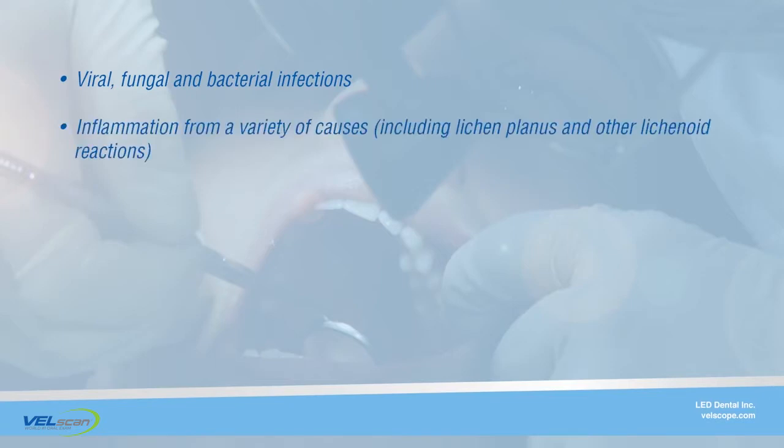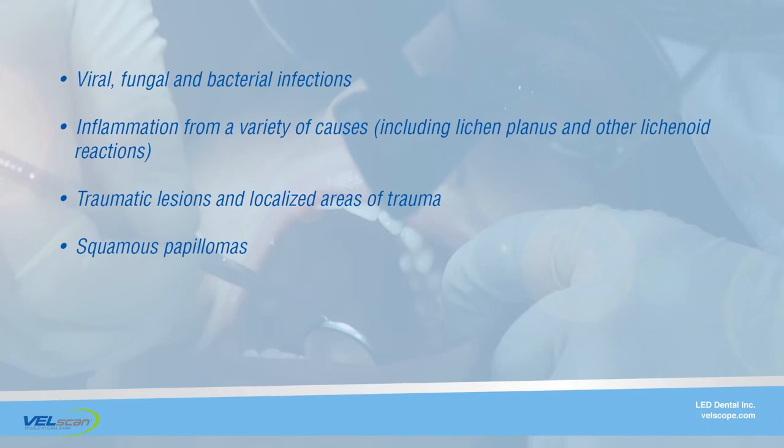Inflammation from a variety of causes, including lichen planus and other lichenoid reactions. Traumatic lesions and localized areas of trauma. Squamous papillomas and salivary gland tumors.